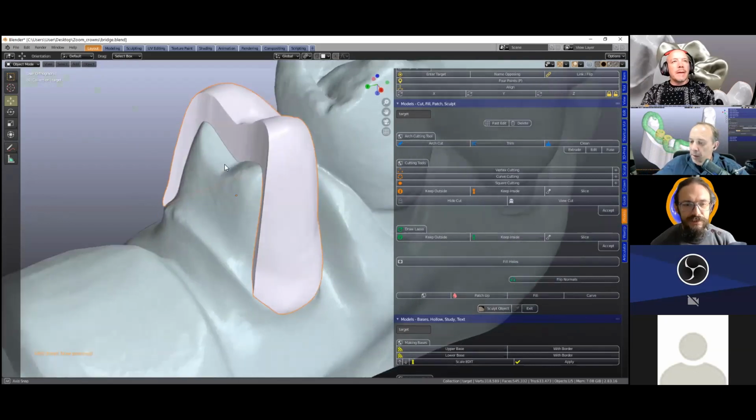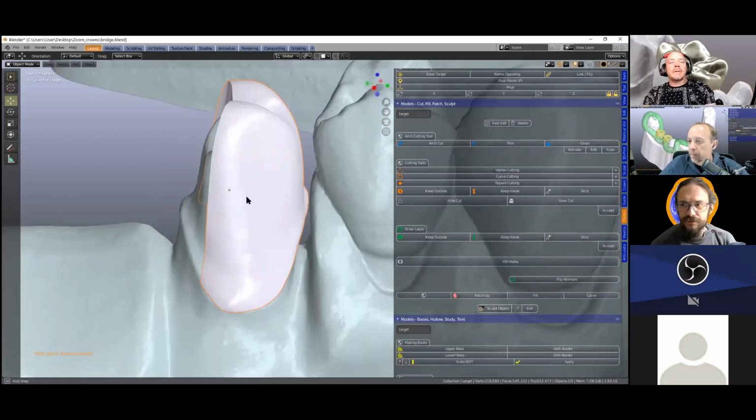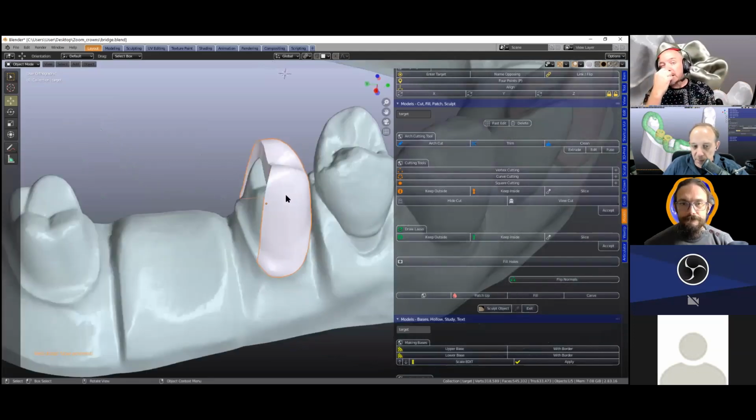Okay, very nice. So that's good, a reduction coping. This is why it's so good that we can make our bridge and coping, and chop and change within the module, so we can create this and not have to do all the digital work from scratch. So that's a good alternative.